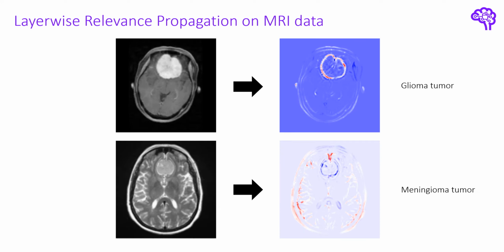Okay, so now we can have a look at how the method works in practice. I downloaded a brain MRI dataset from Kaggle on which we will apply this method. All the code is pushed to GitHub, you find the link in the video description. The goal for the dataset is to not only get predictions if there's potential cancer tissue on the MRI scan, but we also want to know which neurons were important for that specific prediction, such as shown here.